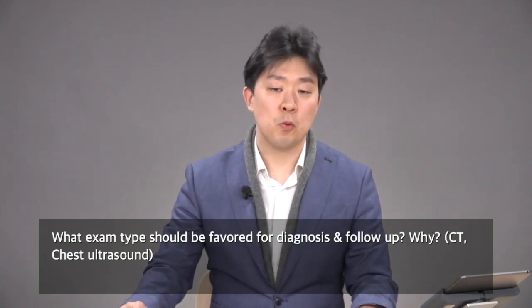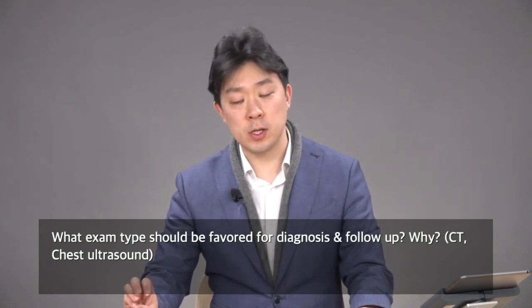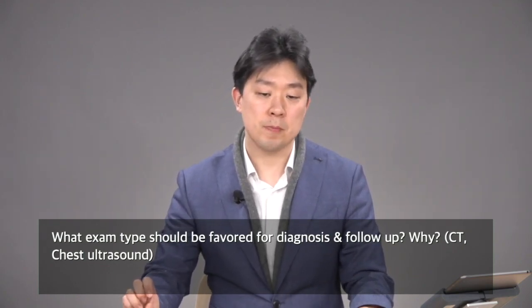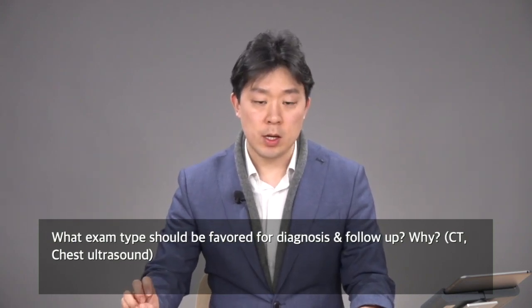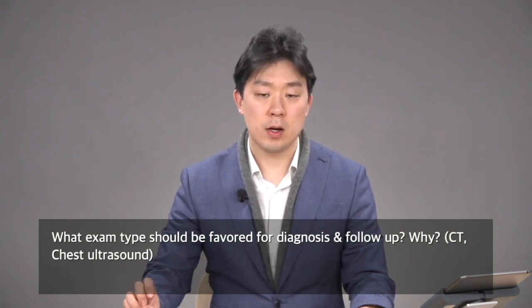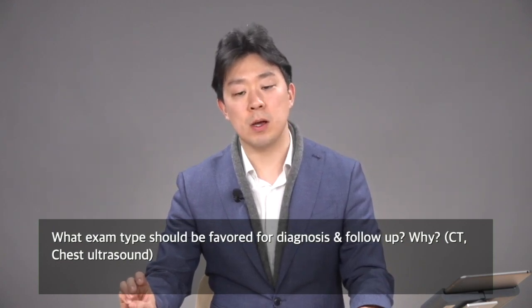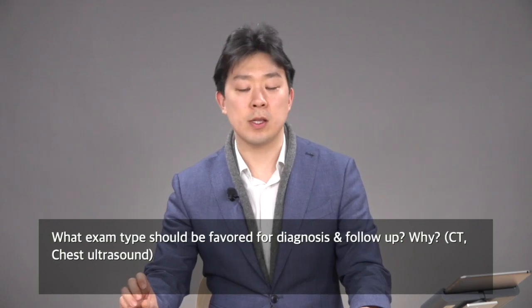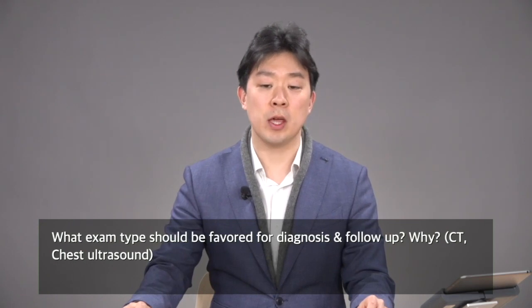Imaging modalities for workup of COVID-19 patients depend on human and facility resources, availability of disinfection, and disease severity of the patients. In the setting without a significant constraint of resources, chest CT can be used for the patient with moderate to severe pneumonia to assess a disease burden, a pneumonia burden, and other potential complications of pneumonia.